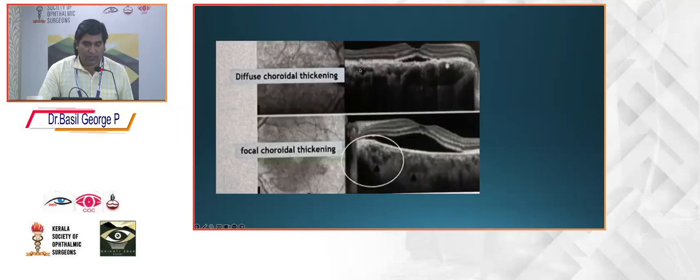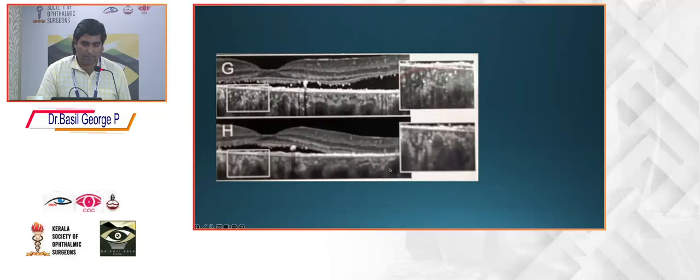The EDI OCT or the SS-OCT also shows diffuse choroidal thickening, or it can be a focal choroidal thickening. And this is an OCT which shows choroidal hyperreflective dots seen in the chronic CSR, which suggest an inflammatory origin to the pathogenesis of CSR.